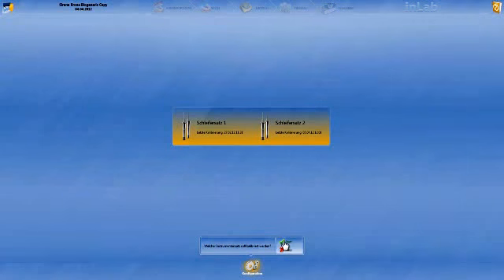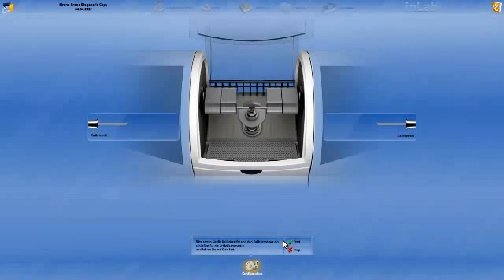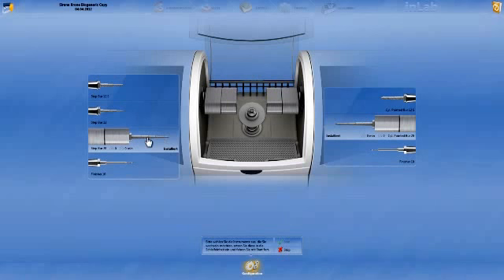If the burr set is highlighted in yellow, it is active, and I confirm by pressing Start. The machine aligns its burr sets. I insert the calibration pins and the calibration triangle and confirm again by pressing Start. Following calibration, I select the burrs which I wish to use in the burr set. Burr set 1, size 20 burrs for the sintered ceramics, left step burr 20 and right cylinder pointed 20, and I confirm again by pressing Start.